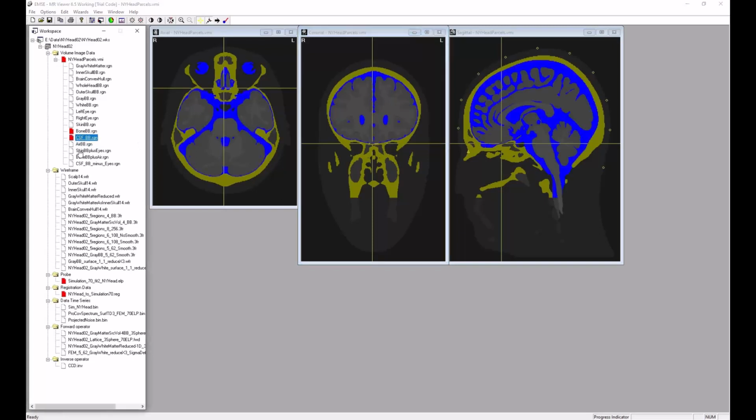The New York head, we have the convex hull is this on the New York head. See how it goes like this. And actually, we make the convex hull on the individual. And this one is actually the major thing we're using to create the affine transformation between the individual and the New York head.